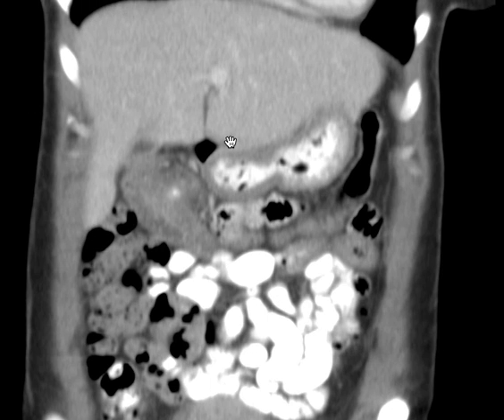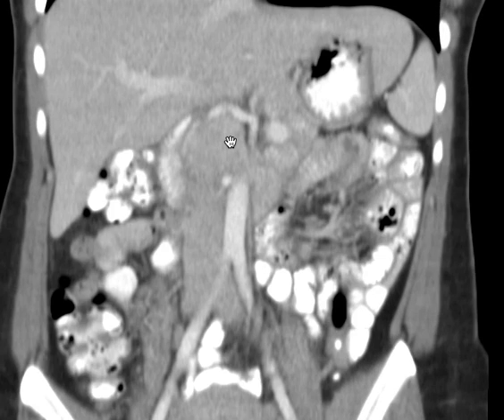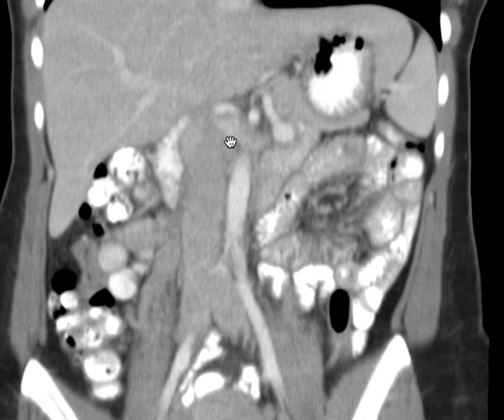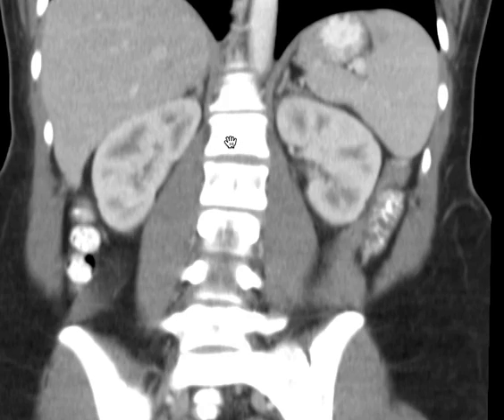Don't feel like this is something you've got to write down or focus on intently. My goal is to have you hear these things and see them repeatedly, many times, and these structures will become like old friends to you. I think. I'm pretty sure.